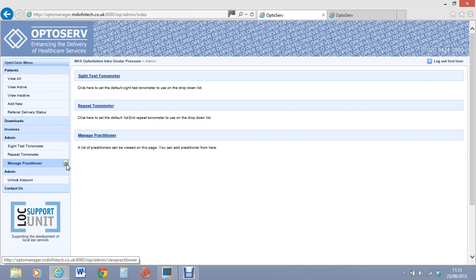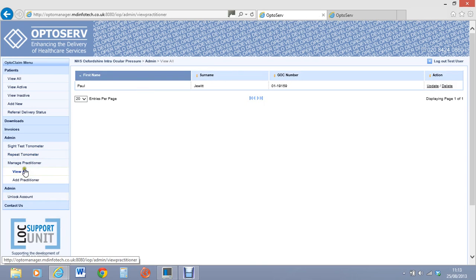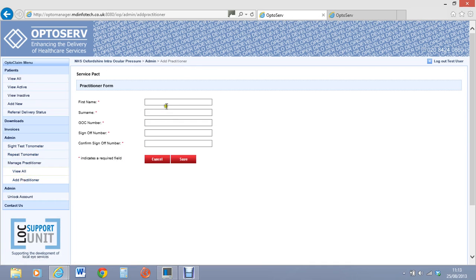And then the last one is to add your practitioners. So manage your practitioners, and I think I've already added myself here, so I've got myself added in there. But let's say you just want to add another practitioner. We'll make up a GOC number 1669.